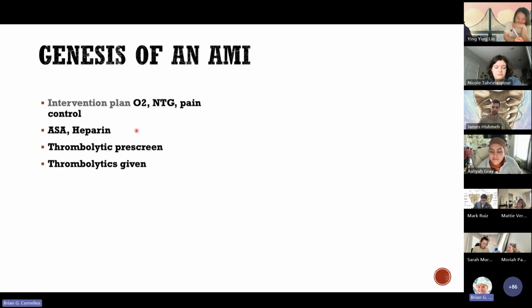So sometimes what you'll see in these patients, not related to the pain discussion, is that they have ST changes that are associated with increased myocardial demand. So they do okay if they're sitting there, but then I ask them to walk up a flight of stairs and they start to have ST changes. And then they stop and they go away.